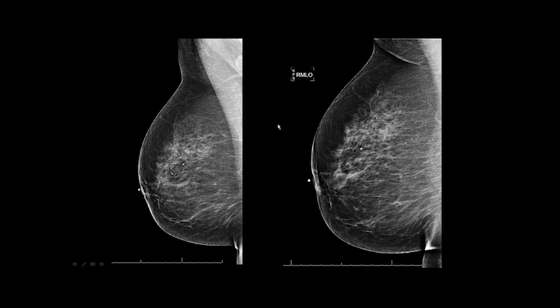So your technologists really need to be careful when they're judging if they need to use a small paddle or large paddle. I've judged wrong before. And I've taken maybe an image like this. I'm like, oh no, I need to repeat it. At least you repeat it and you learn from it and you don't do it again, hopefully.